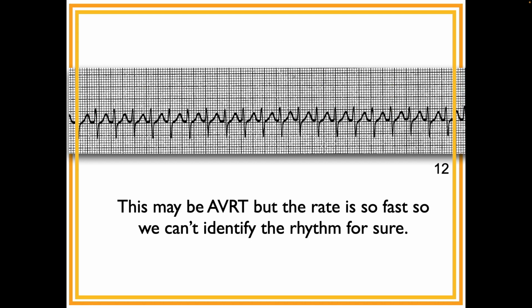Again, here we have it again. This could easily be AVRT. It's regular, narrow complex, very rapid. These are the T waves, so no discernible P waves. It could be AVRT, it could be AVNRT, it could be junctional tach, it could be atrial tach.